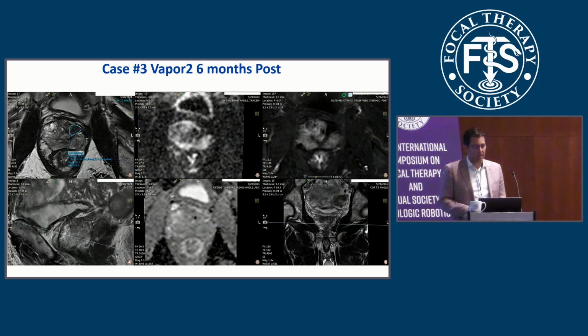And then post-op 6 months in the follow-up prior to the biopsy, you can see complete contraction of the space without any enhancement. I think all these things are really interesting, but your radiologists need to understand what all these things look like and that they're slightly different, and they have to be able to comment on these. And they should be using the target nomenclature at least as a basic starting point for them to assess.